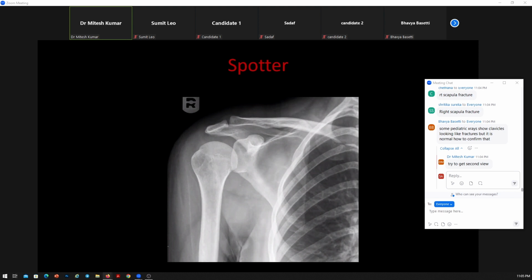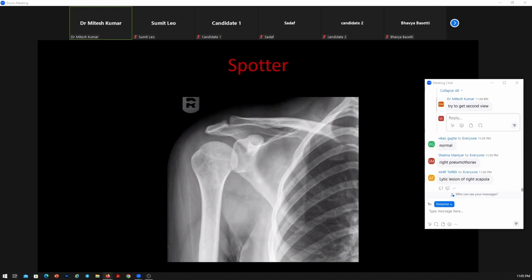Please use the checklist. Now let us see what it is.